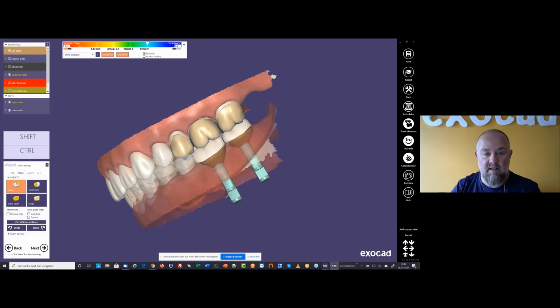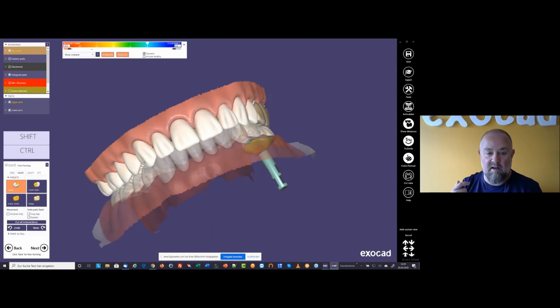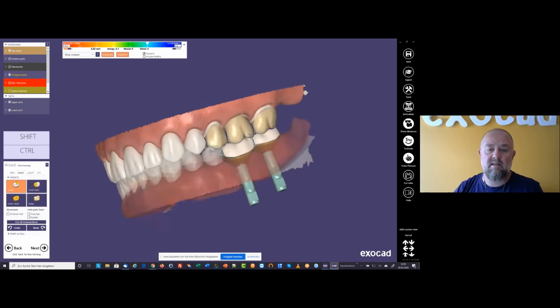Here in the chair side, it's different. So you cannot choose any articulator. It's just a generic articulator with a center position. And if you use it, I really recommend to scan the entire arch, because otherwise the influence of the opposite teeth on the movements will not be respected when doing the movements. So as I said, it's just a generic articulator. We do the movements. It's not exactly what is the situation or the movements in the mouth of the patient.